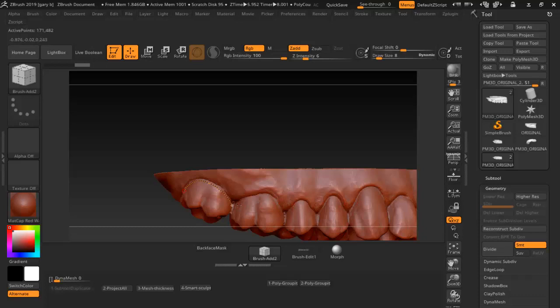If for some reason you have another break in the line and you don't connect, this is what's going to happen. Alright, I'm going to move over here, but this one's not highlighted all at the same time. So you have to connect. Make sure you connect to that one. And the way to double check that is to hover over the line, and see if it's all one red.